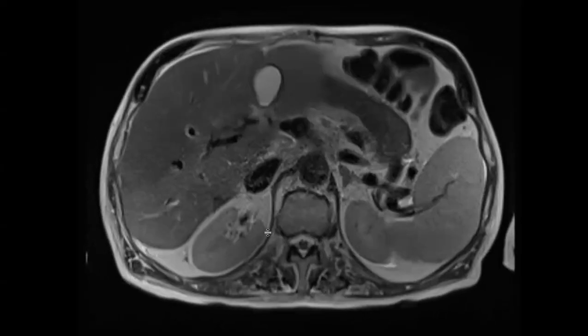Any other pearls? No, that's great, Yashant. And I think it looks good for lymphoma, right? It's so infiltrative, diffusion restricting, obliterating planes. But that's crazy that it happened so fast. When you asked how to differentiate infection from PTLD, I think MRI is really helpful. It was so much more suspicious on this MRI, right?